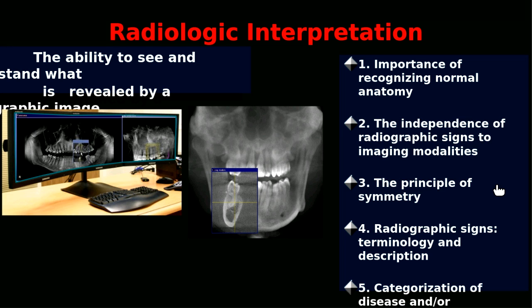And also use the right terms. In CBCT and CT images, if it's dark, you can use hypodense. If it's bright or radiopaque, you can use hyperdense. And if it's in between, you can write heterogeneous area. Finally, you can categorize the disease based on your needs. You have to categorize the disease in the end. That'll be your final step.